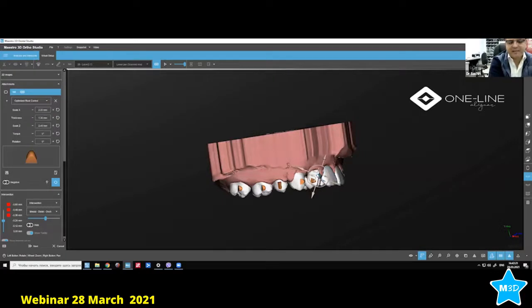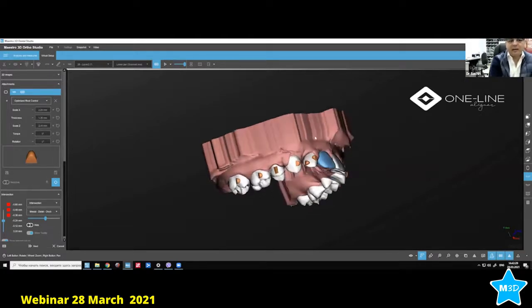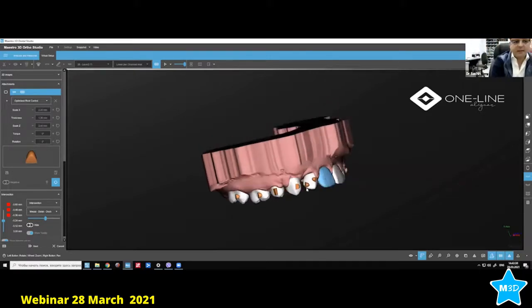You have to go as mesial, as incisal, as gingival, as distal as possible. Same logic: you have to be at the corners. If you are in the middle, it will not work. Use it in the corners as much as possible. Again, the size matters. But you can't get an extrusion with this kind of placement. This is only for tipping. So now, if you want tipping and a little bit of extrusion, yes.